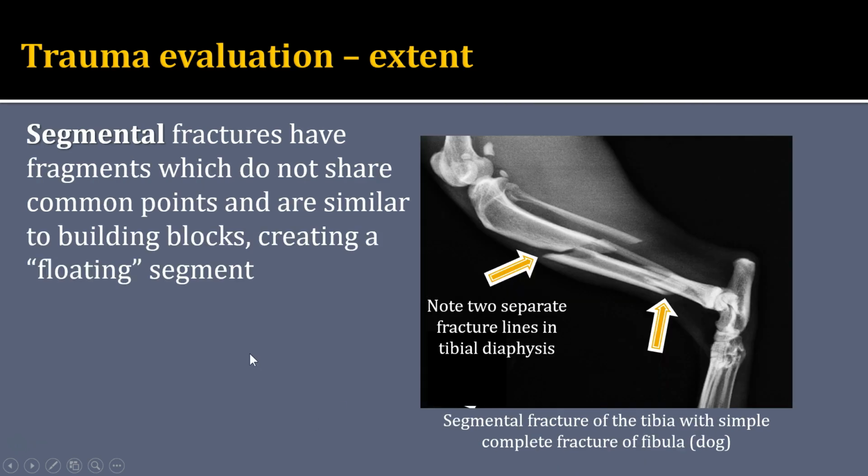We may less commonly identify what is termed a segmental fracture. This is a fracture that doesn't share a common point. There are like building blocks, or a floating segment of bone, from two separate fractures within that bone.